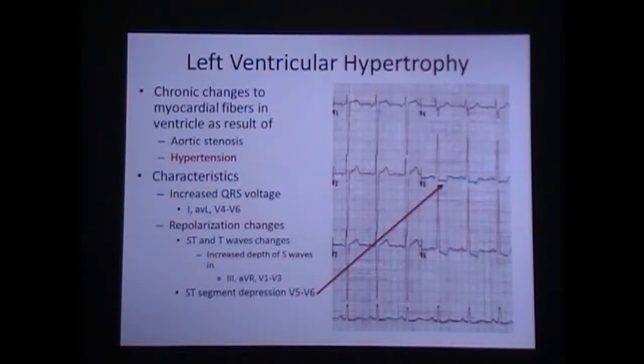And then we like to focus in, ooh, we got ischemia. But if I've got all those other characteristics and the other clinical picture is not telling me it's ischemia, this is most likely left ventricular hypertrophy. So look at that picture. My QRS complex is really tall. Do I have S waves in my V1 through V3? Those kind of things, and I've got some ischemic changes in my ST, then it's probably not ischemia. Okay?